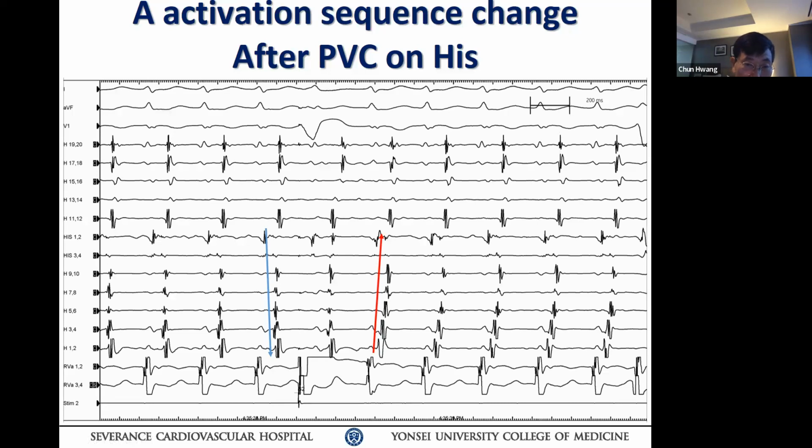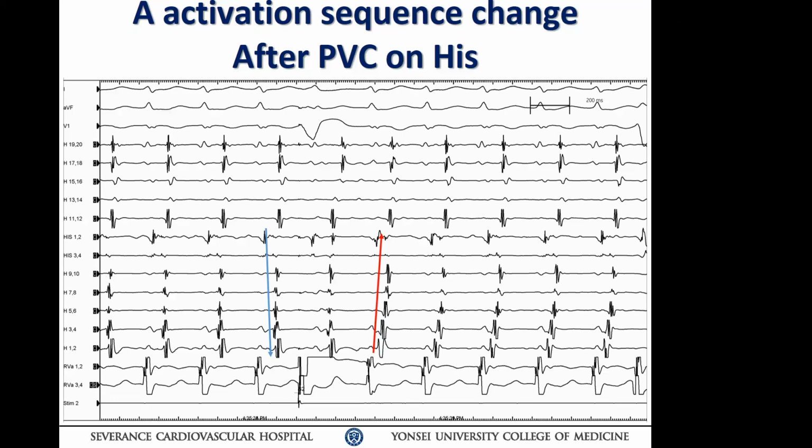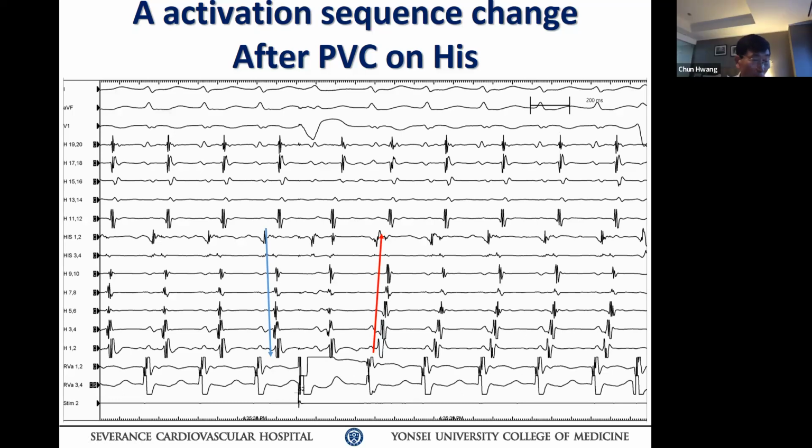Therefore, septum blocked, right? Correct or no? Yeah, because you're closer to the pacing site, that pathway is going to block first if you have an equal refractory period. That's what happened. I can understand that.